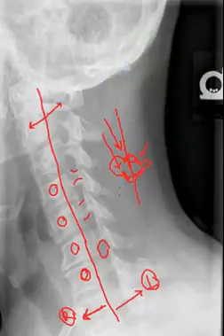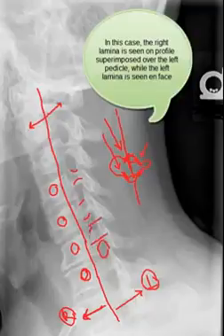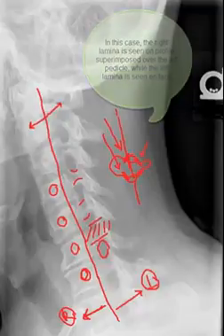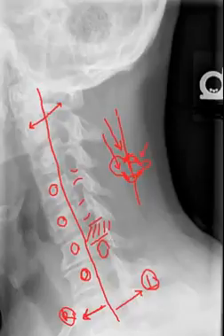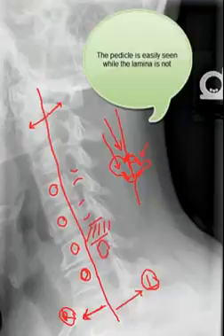And so in this particular case, we're going to see right-sided lamina on the left side of the patient, and they're going to overlie the pedicle region. So in fact, there's a faint little line you see here, and the right lamina is actually superimposed over the left pedicle. Now, in no testing situation will an instructor that I know of ask you to differentiate these structures. It's not seen very well.